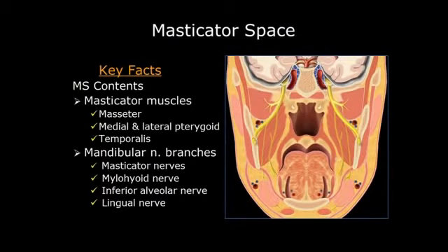The muscles of mastication are all innervated by that masticator nerve that comes off quite early, and if you cut the V3 at the skull base, you will lose all the muscles of mastication on that side, as you will lose the mylohyoid muscle and the anterior digastric, which is the distal mylohyoid motor branch off that. So keep going here. Let's move along.